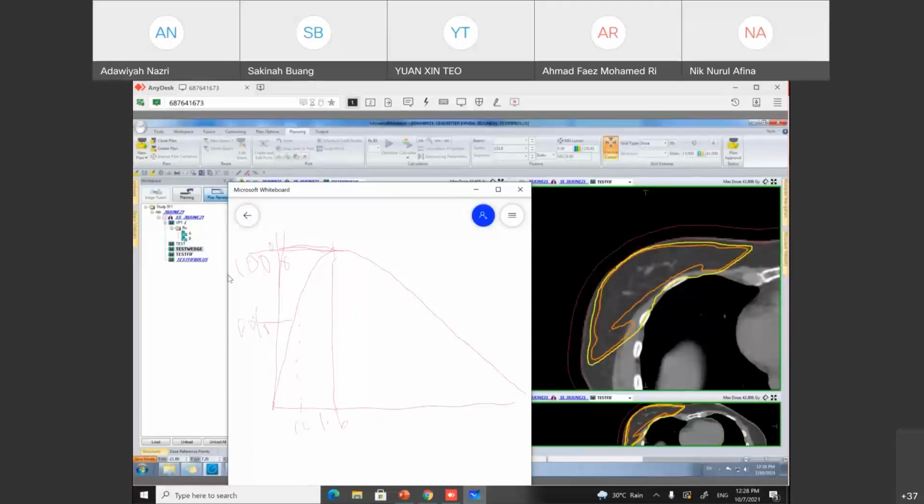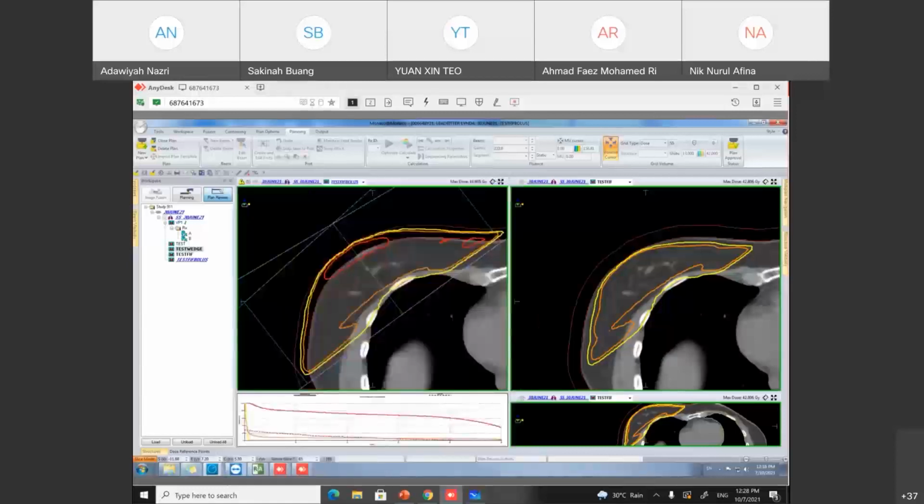This is why after we put in the bolus, we trick the treatment planning system. Our Dmax will be calculated from the bolus point to 1.6 cm. Of course, in this plan the prescription point is at a different place.